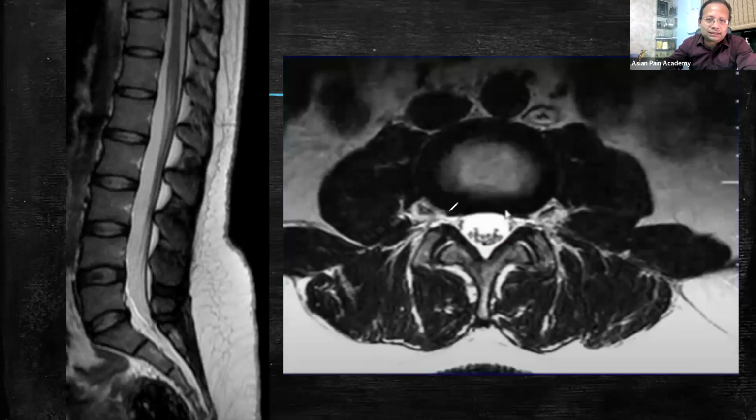Now, this concavity is normal, okay. But in the lumbar spine, this section may be at the L3 level, like that. If it is in the lower area, then it is always possible that this concavity is not there. But if the concavity is not there, you should not immediately jump to say that it is very much abnormal. No, in the lower spine, L5S1 or disc base L5S1 or L4-5, it is possible that this concavity is not there.